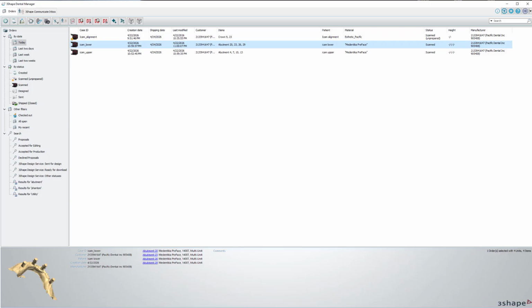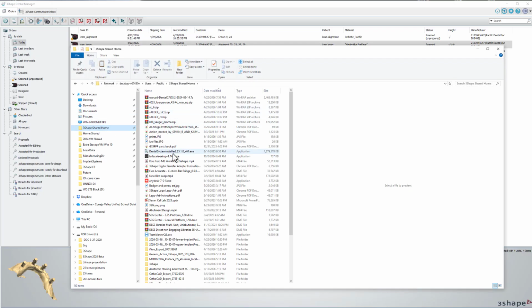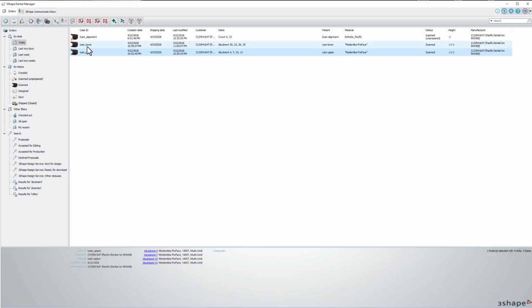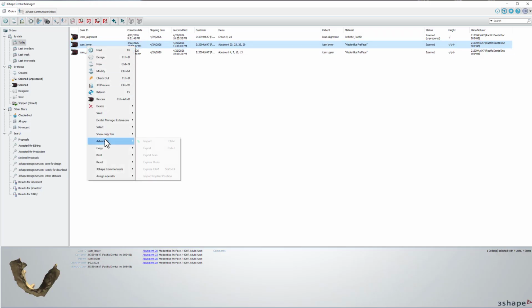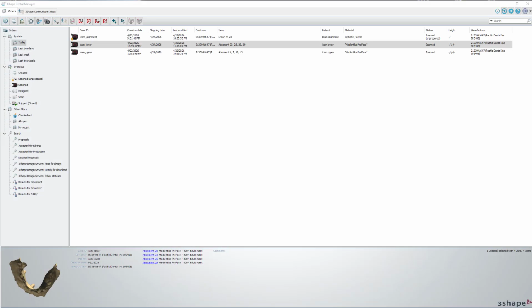that came across, that I brought over right here, right? So here's the aligned 3shape lower STL, and we're going to do this. This is the implant information that I'm going to inject now. So we know what we did with the upper. So right click, advanced, import implant position, import that XML file, and now we're ready to go.